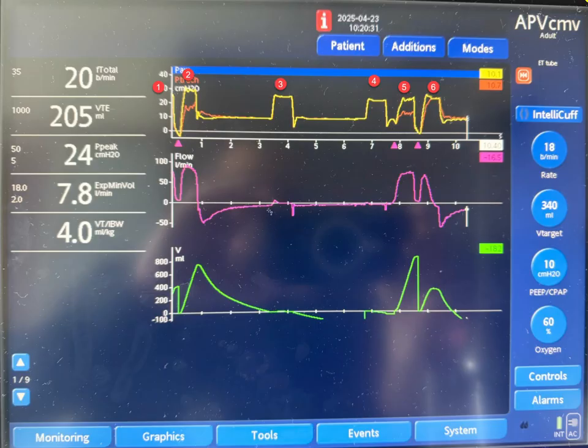If you go up, you will see that there is some inspiratory flow here, but 0 flow here. And this is correlating with a machine delivered breath. So this is 1, 2, 3, and 3.3 seconds. So there's a mandatory breath here. The machine gave the breath with the pressure lower than the previous pressure because the tidal volume was larger than 340, so the pressure will be regulated gradually down. However, this breath did not result in any tidal volume, no inspiratory flow.